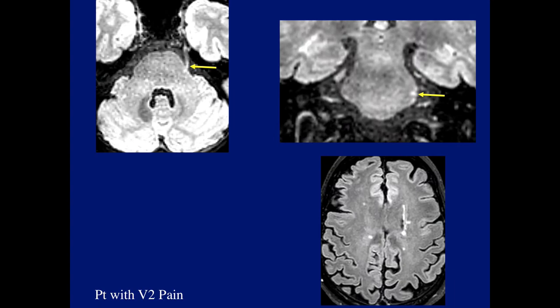So far I've had several answers, but not the correct one. What's the correct answer? I have not seen the correct answer yet. Please look at all the images. What about the brain image? Looks slightly characteristic? Correct. Asif has mentioned the correct diagnosis.